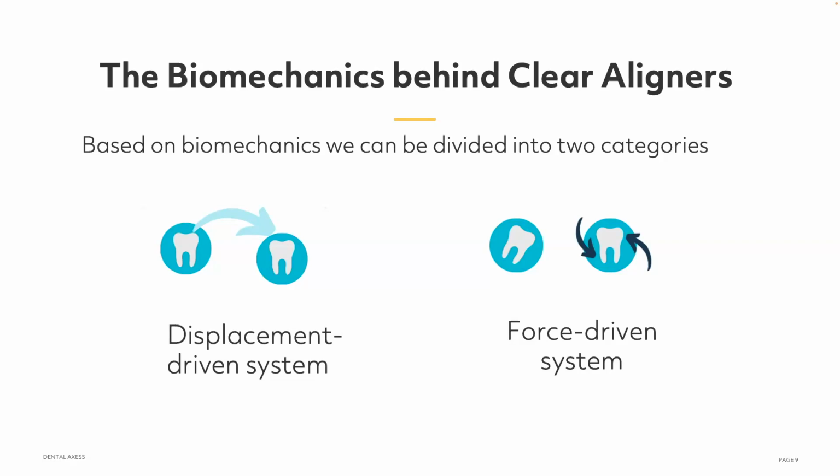And it's basically that the aligner has a pressure point. That means the aligner will move the teeth, creating pressure in some areas. This, with attachments, gives us the chance to create more complex movements, like big rotations or significant torque, extrusion, for example. So this opens up more complexity in the cases, because the tooth does not need to move to fit into the aligner. The aligner will make the movement, creating pressure in specific areas.